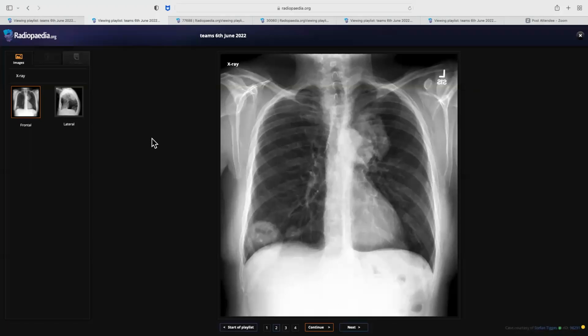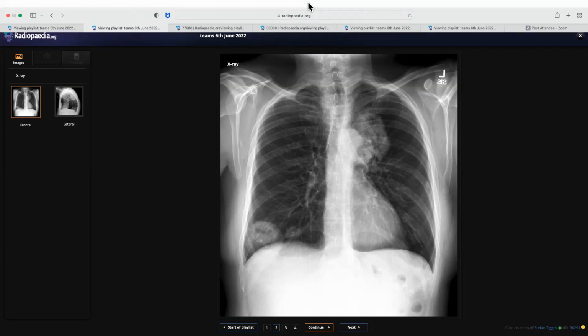So, in summary, we have multiple bilateral lesions, opacities with central lucency. So I'm thinking about multiple cavitating lesions, like multiple abscesses or multiple metastatic deposits. Other possibilities would include granulomatosis with polyangiitis. So I will convey my findings to the referring physician and compare with any previous examinations, and request further assessment by CT for further characterization of these lesions.